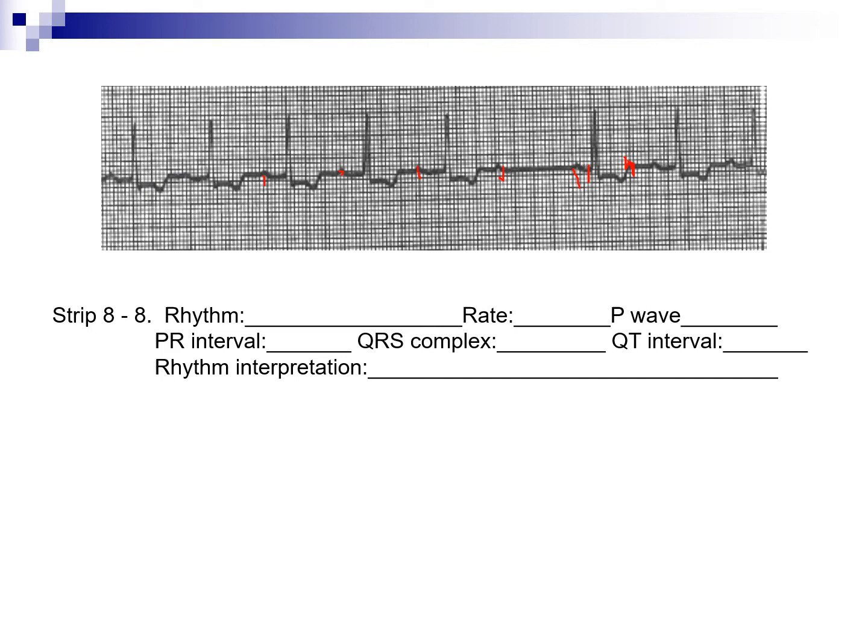Because the R to R is considered irregular, there are more P's than QRS, so that's why it does fall into the higher grade block. And with the R to R being irregular, it cannot be a complete heart block. And since the PR interval is not constant, it cannot be a second degree type 2. So process of elimination, we are second degree type 1.